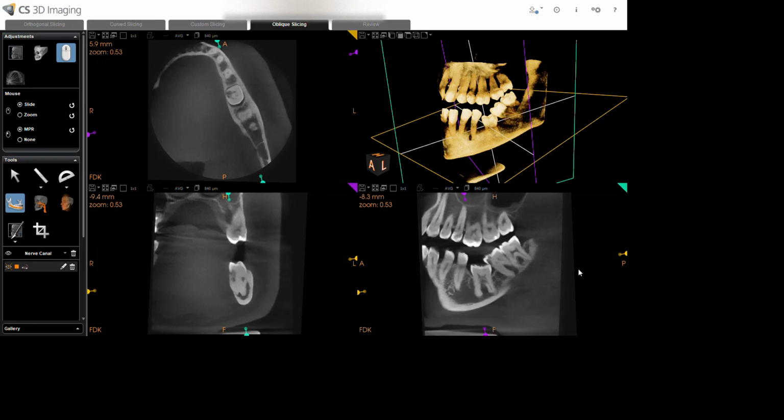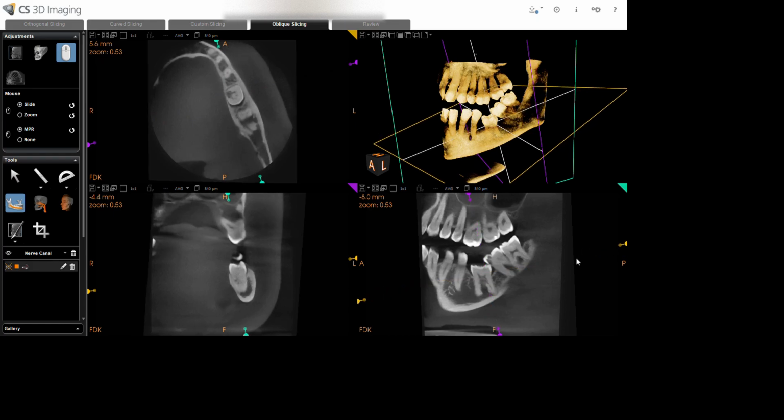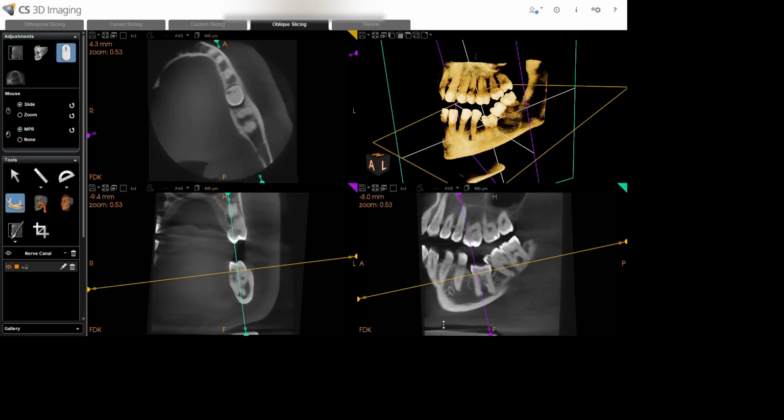So here you can see, if you see the root, you can't appreciate the periodontal space. So definitely there is ankylosis in association with both the mesial as well as the distal roots. Now this is concerned about the roots, their association with the canal and the crown. Now if I go into more detail, as in what all things I want to know about the resorption, again that's a very important aspect. So definitely this tooth doesn't seem to be restorable.